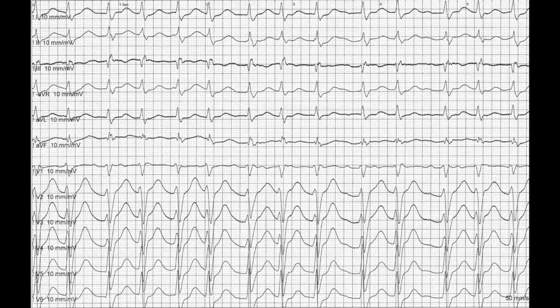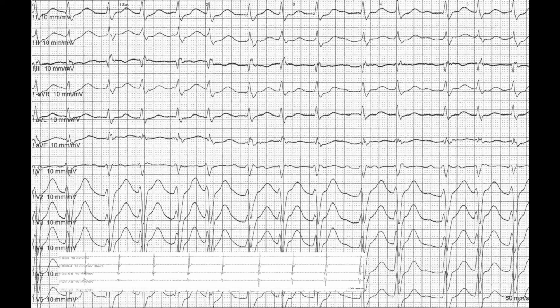The patient underwent EP study where this arrhythmia was induced. The following was his intracardiac CS activation. The intracardiac recordings show a regular atrial activity with irregular ventricular response as already suspected by reviewing the surface ECG.